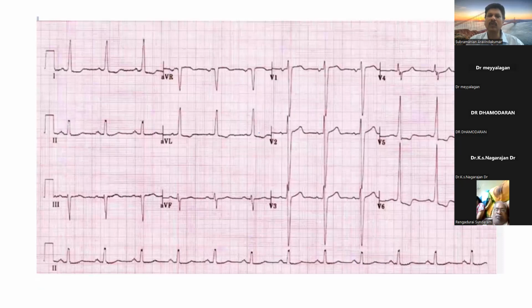So having known how to look into it, we will see the ECG. See here, the first thing is left atrial enlargement: P wave terminal negativity is there. The P wave in lead 2 is slightly widened. It's not classic, but slightly widened. And the height of the R wave, see here, is a very tall R wave, whereas in lead V1 there is a very deep S wave. And there is ST depression with convexity upwards, and a T wave inversion. So typically, this is a left ventricular hypertrophy. Increase in the ventricular activation time.